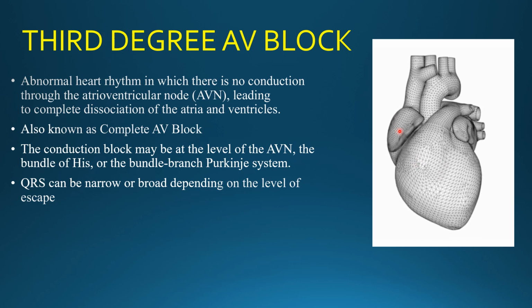For a sinus rhythm, every P should be followed by a QRS. Now this video over here is showing a normal healthy sinus rhythm. We can see that every P and QRS are in synchrony. Okay, we can clearly see over here. So the atria contract, the conduction travels down, and the ventricles contract. So this is a normal sinus rhythm.